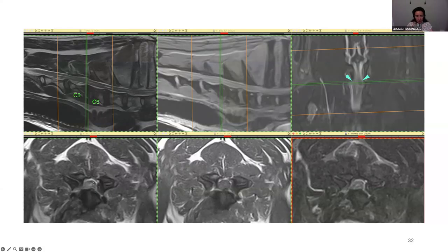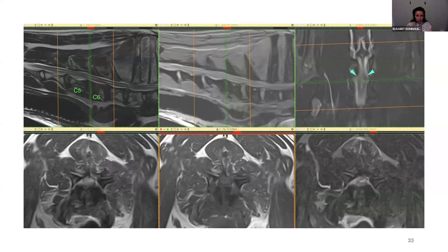And we see also that this spinal cord shows no signs of compression, but there's a little bit of an intramedullary lesion that was present before. So this was present before the slot. It's not a new lesion. And here a little bit more caudal.